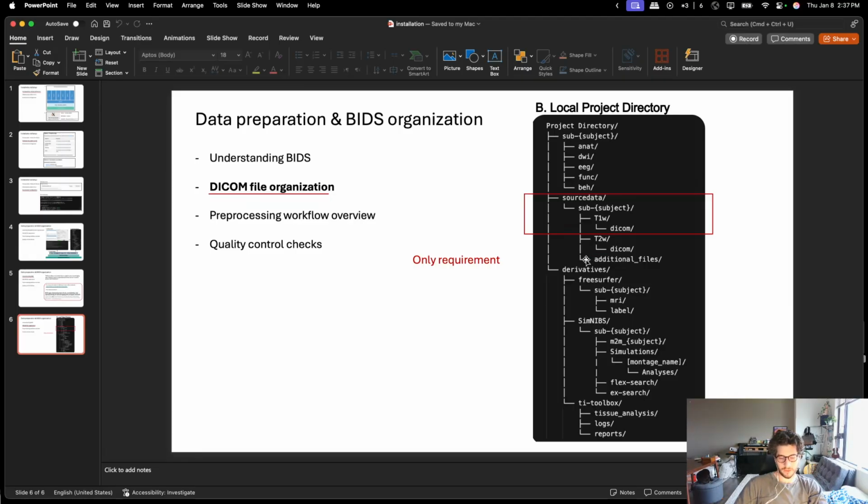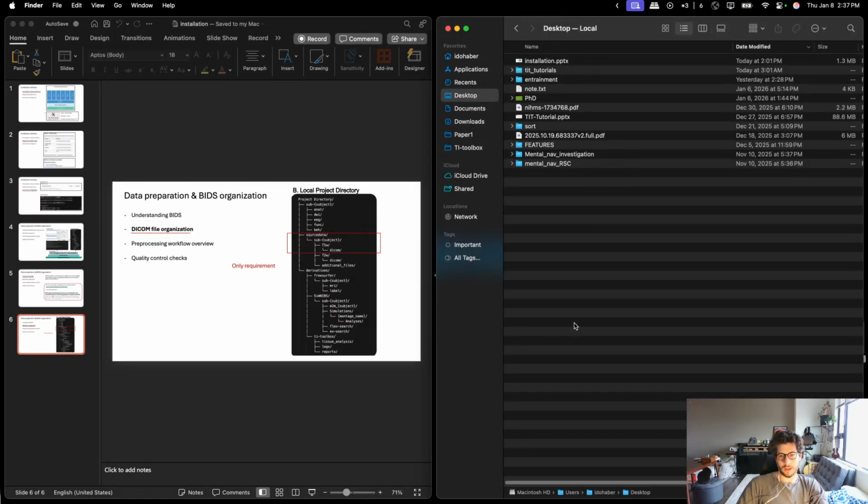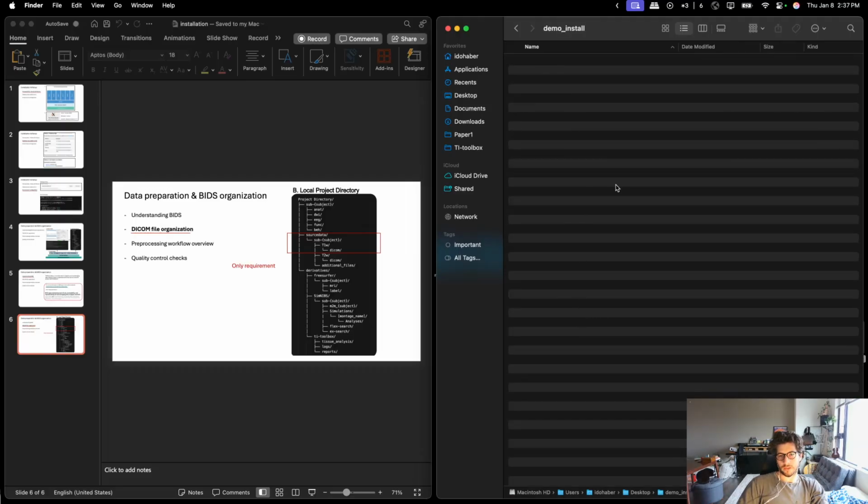We should do a quick demonstration, I think. So let's go to the desktop, and we can create a demo install. Okay. We'll go to the demo install, and as we said, the only thing we need to set up is a source data.